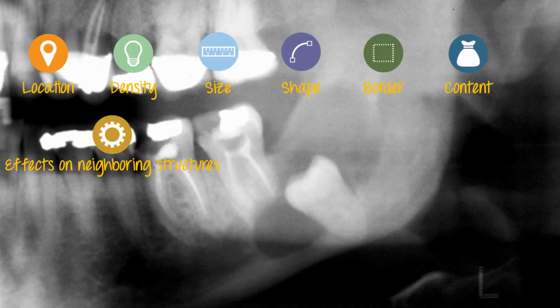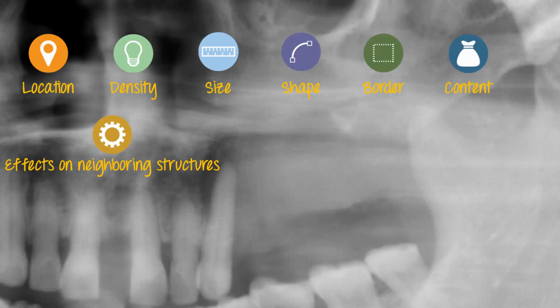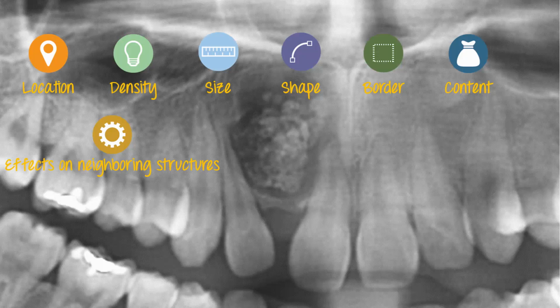Is the third molar displaced? Is the mandibular canal displaced? How is the alveolar crest? Is the premolar rotated and displaced? Is the palatal cortex intact? How is the sinus floor? Is it eroded? Why is the canine still upright? How is the condyle? Is the surface of the condyle flat? Are the roots of the maxillary anteriors flared?